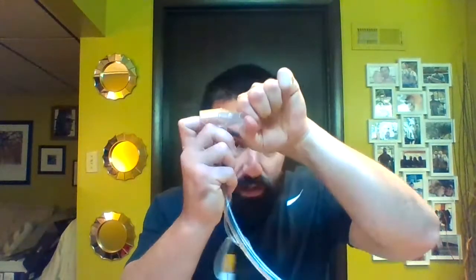And once again, I said that hooks up like that. Your ambu bag is going to hook straight up on the side right there. We don't need to get in a hurry ripping this thing off right away. There's no reason why you can't leave that on as you're manually ventilating until we secure the patient's airway. But the limitation on these is they're typically limited to just placement of airways.